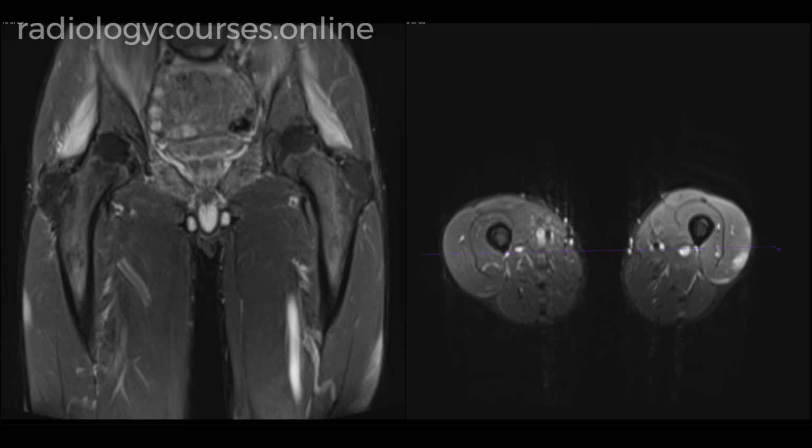Here we have MRI of the thigh in a 35-year-old male with proven diagnosis of SAE1 dermatomyositis. To give some background history of this particular disease, especially for the radiologists.